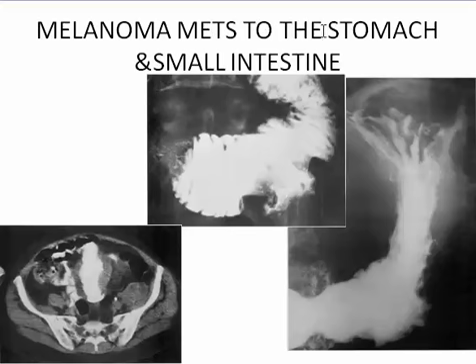Melanoma can give subserosal deposits to stomach, small intestine, and colon, causing irregular outline, narrowing of the lumen, definite limited capacity, and thickening.